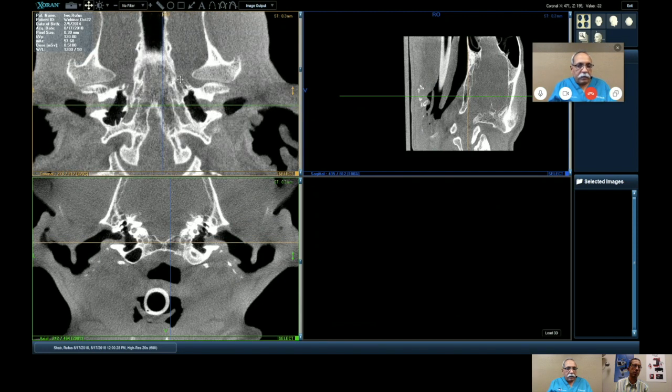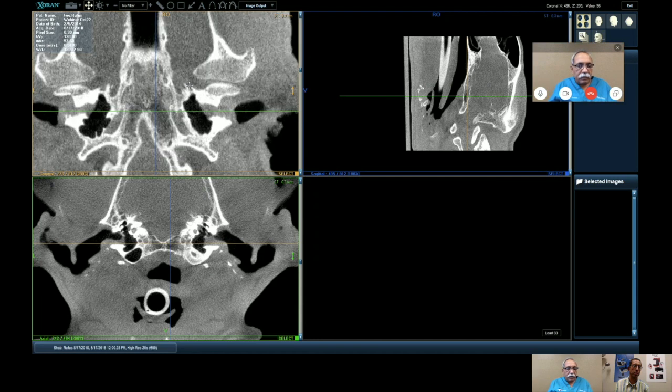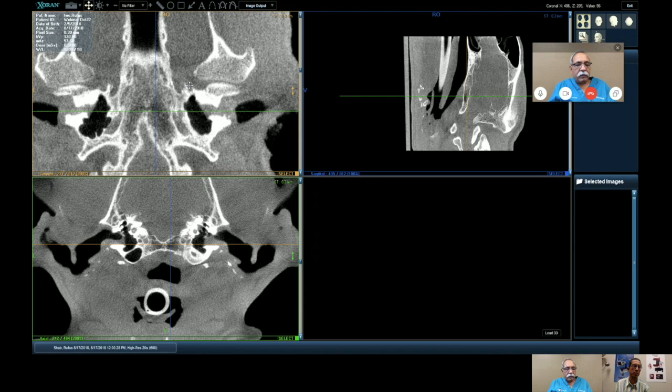And then there it is. There is a tube right there. It is very thin. So the one-third of the eustachian tube towards the middle ear is a bony canal, and two-thirds towards the nasopharynx is the cartilaginous eustachian tube.